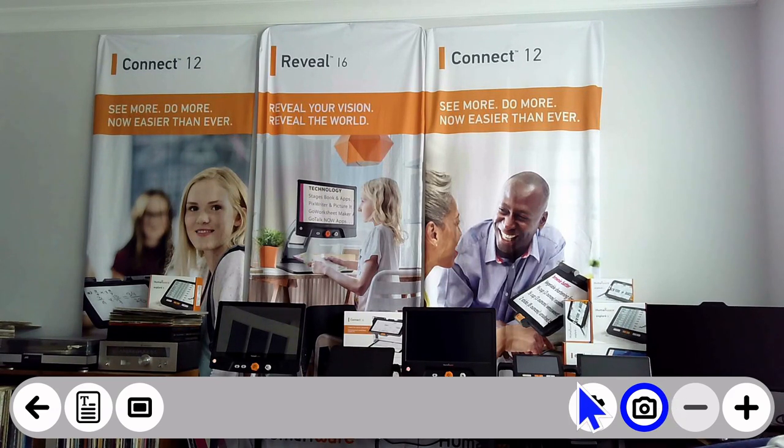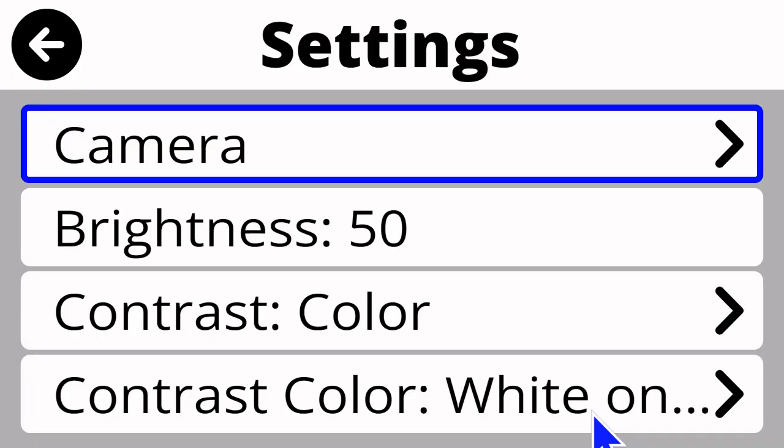But you may have questions about how did we get a distance camera set up. So let's tap on to this gear wheel. It's the fourth in from the lower right of the screen. And this will open up my settings for my distance application. At the very top of the list is the camera, and then below it are additional settings that I might want to employ when I'm using my camera.